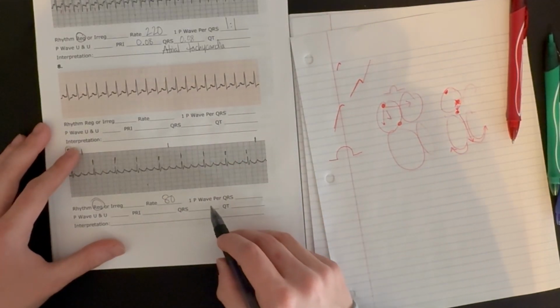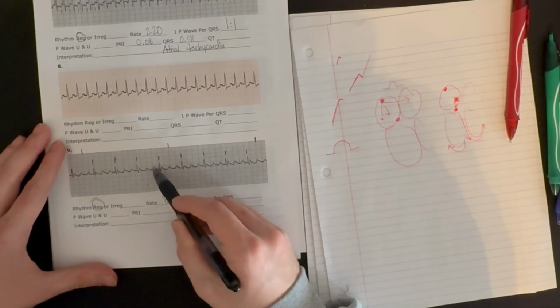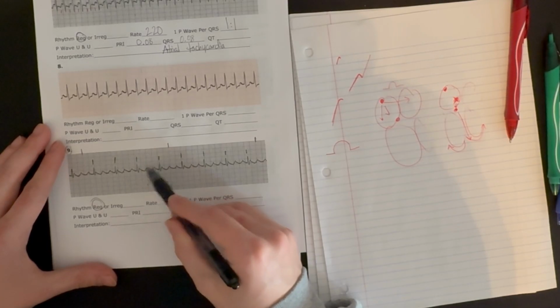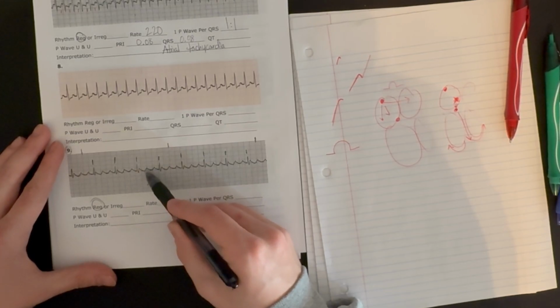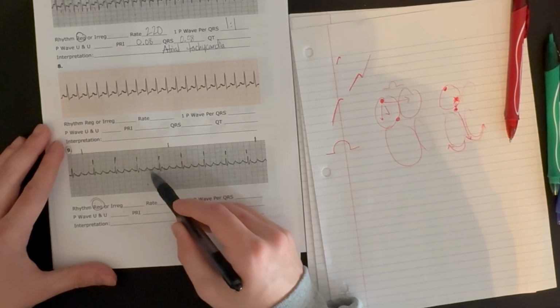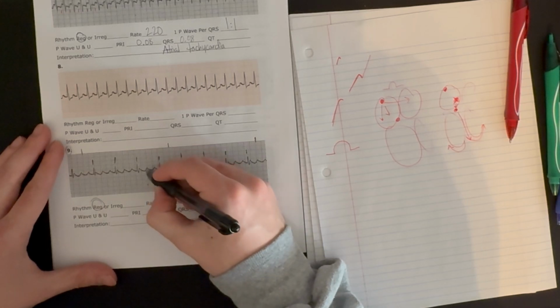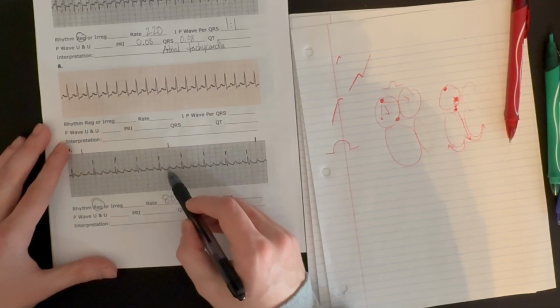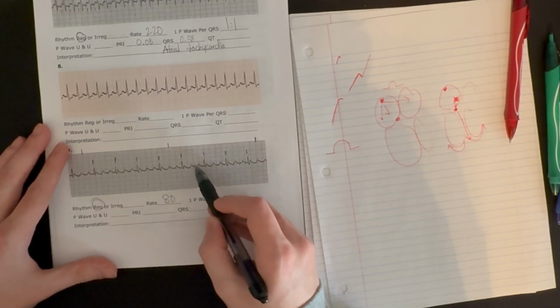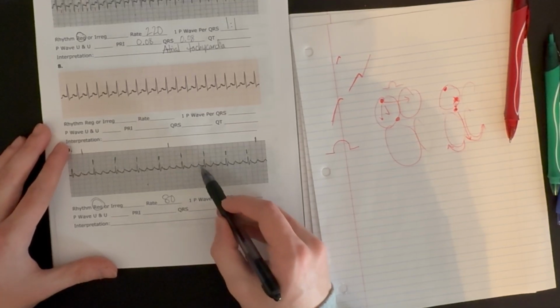But let's look at our P to QRS ratio. And what do we see? We see 3 upward deflections between each QRS complex. Now, every time you have a QRS complex, a ventricular depolarization, it has to repolarize. So one of these is likely the T wave, but then we have 2 P waves. So we have a ratio here of 2 P waves for every 1 QRS. Depending, this might actually be a third P wave, but it's likely some sort of T wave here. So we'll say this is 2 to 1.